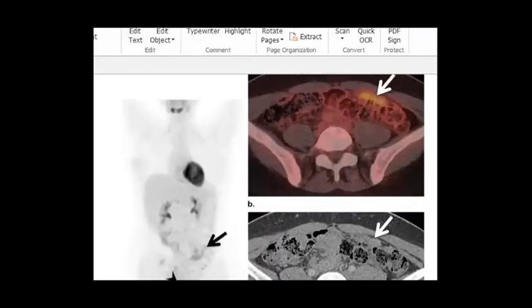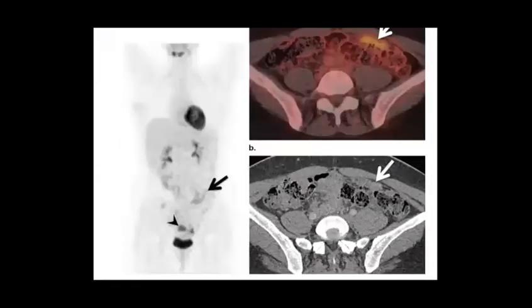Let's show you something very similar. So what do you see here? Yes, this patient, perfect, has omental cakes. Then in the CT, when you find this, just look behind the anterior abdominal wall muscles.